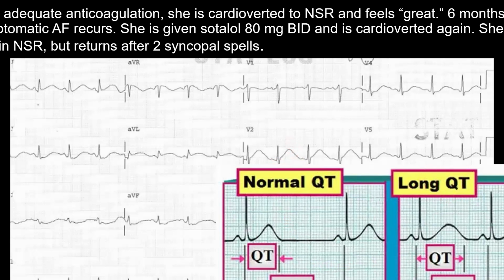and what is the arrhythmia that she's likely to have had that caused her syncopal episodes? Do you know?